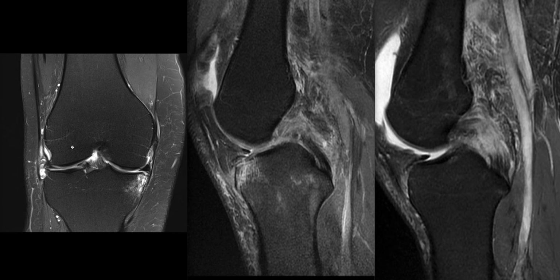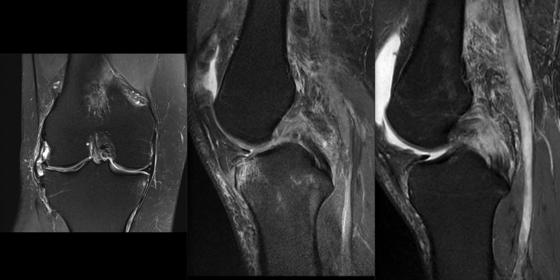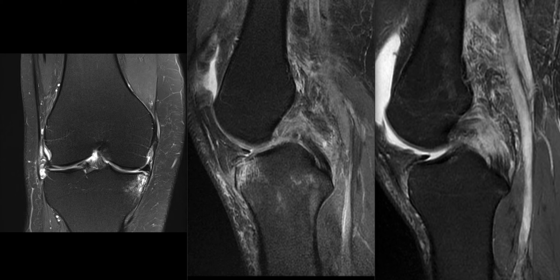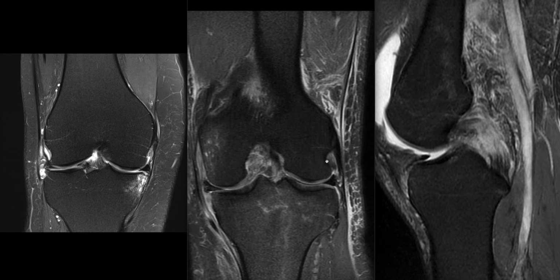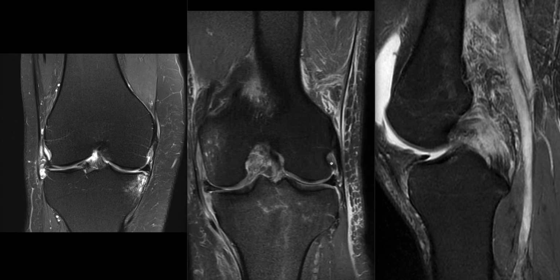In this patient, there is an example of another associated injury, which is important to look for because it's easy to overlook. If we just turn to the coronal image in this patient first and look at the posterolateral corner, we can see that the popliteus tendon attaches here within the popliteus fossa. So this is a nice normal popliteus attachment.